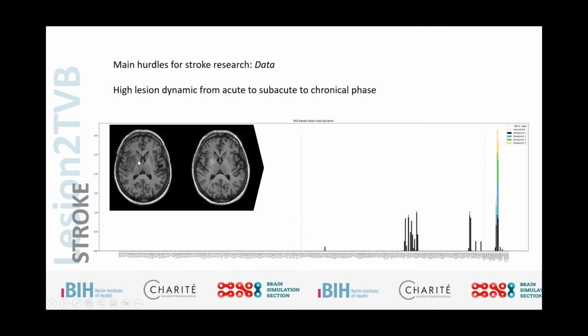We already can see a significant change, and we can see really the significant dynamic of the lesion in the brain, right? Like with pretty much any injury that we have to our body, the body is amazing and adapts and tries to compensate. And here we see this large dark spot in the cortical, also in the subcortical regions representing our lesion. And then in the subacute phase in T2, we see that this has been significantly shrunk.